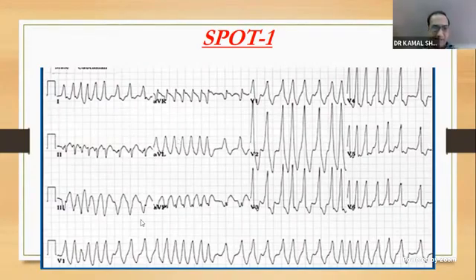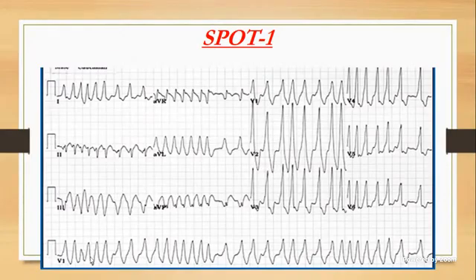Remember, a simple method to interpret is when you're looking at a rhythm strip, which is V1 here. The rhythm strip here would actually be nothing but 10 seconds. So in most of these 12 lead displays with a rhythm strip available at the bottom, the whole plate itself represents 10 seconds. All you need to do is multiply the number of RR intervals here, and you will get the heart rate. So that's pretty easy. You don't even have to count the boxes. Am I clear? Yes, sir. Sunil? So you just have to count the number of RR.